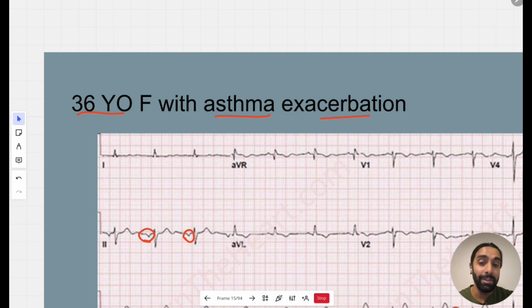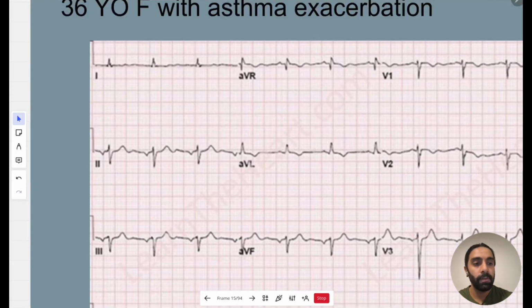You can see T wave flattening as well, but not always. And you should be thinking about too much beta agonist like albuterol that's been given, because that causes hypokalemia by bringing all that serum potassium intracellularly. And the other thing, if you notice here, is lead 1 is positive, but aVF is predominantly negative. So this is left axis deviation.